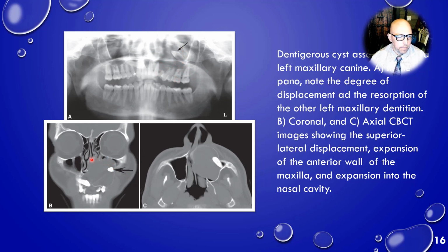Here we see it in three-dimensional view, a coronal view. Borders are very well defined and intact. In some cases, they're definitely corticated. So you're thinking, yeah, well-defined corticated cyst-like lesion or benign tumor. In some cases in here, it's resorbed into the nasal cavity just from pressure resorption.